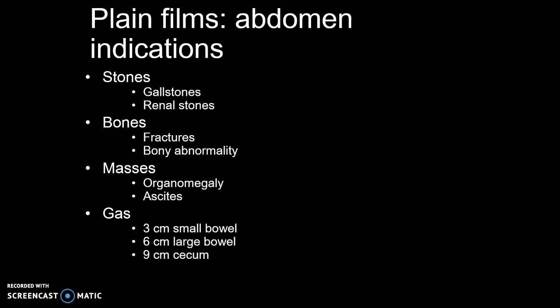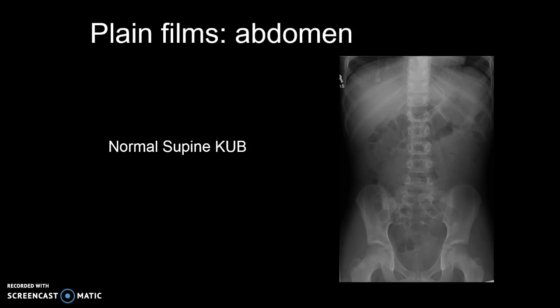The abdominal x-ray can help diagnose some abdominal conditions, such as small and large bowel obstructions. Renal, ureteral, and bladder stones can sometimes be identified on plain x-ray, although it is now usual to use a CT as a first-line investigation to confirm suspicion. Gallstones are sometimes noted on the x-ray, although ultrasound is a much more usual imaging modality when clinically suspected. The KUB stands for kidney, ureter, and bladder, but it can do so much more since it is a quick and easy look.